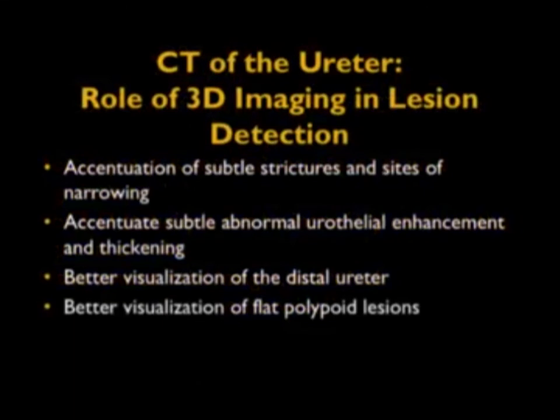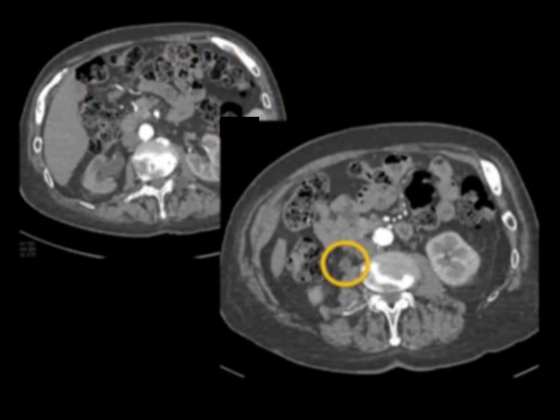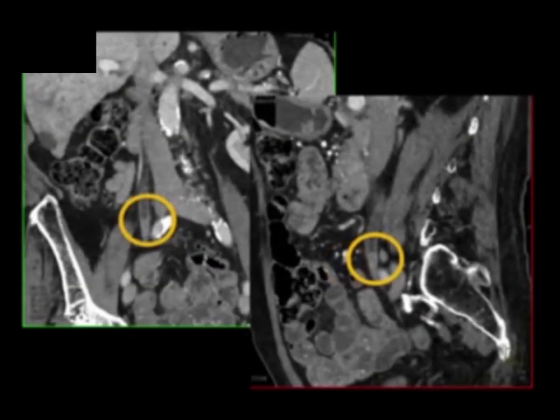Okay, very, very important, particularly when you're looking at the ureter, because we could pick up, if you're careful, subtle strictures, perfusion changes, areas of small mass, all things that are so easy to walk by. Here's a case: right renal hydronephrosis, thinning of the cortex, dilated pelvis and ureter, and you follow the ureter downward, and now you see the mass, sort of a goblet sign. Here's another set of images showing you the tumor in the ureter.